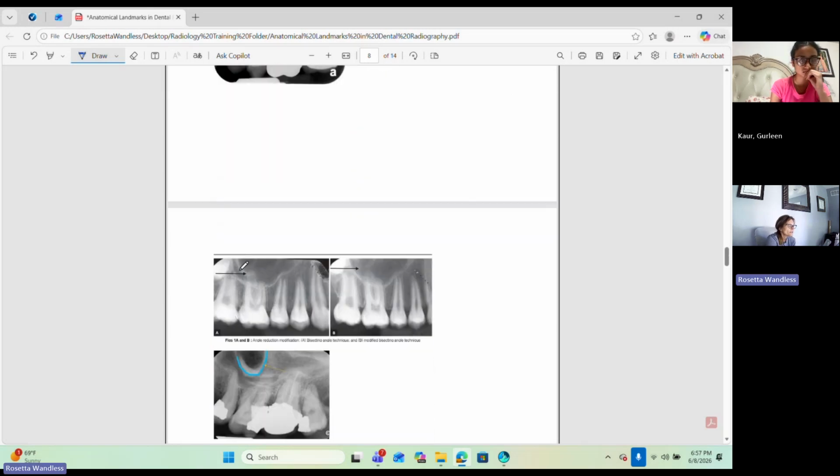Again, you can pretty much see it. This is a J shape here. You can see it very little here to U. So depending on the shot, it will either look like a J or the full U. It always depends on the angle of what you're taking. They're both right. It's just depending on the angle. We're not looking at going, oh, you didn't get the full U of the zygomatic arch. Who cares? It's the teeth that we're worried about. We're just using this landmark to know where we're shooting. Okay.